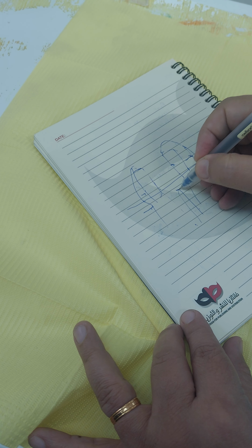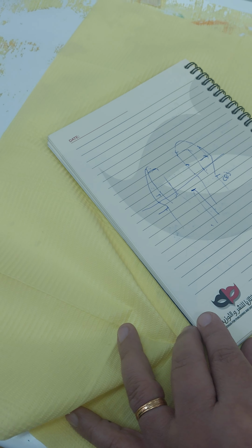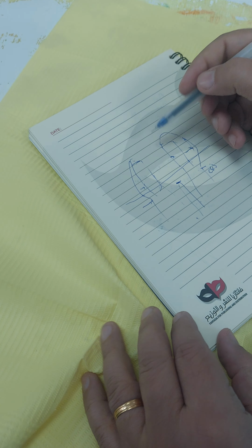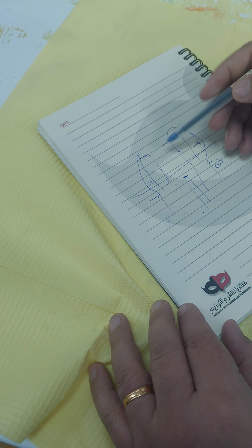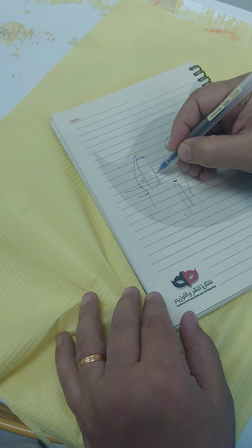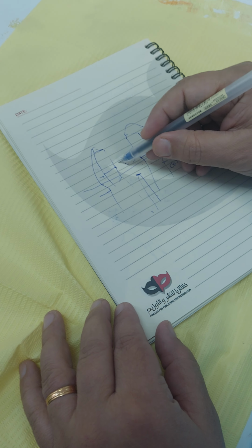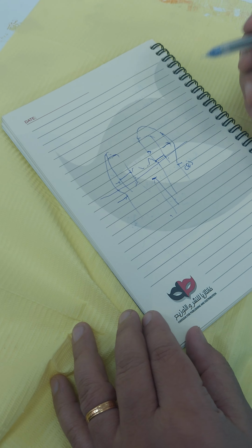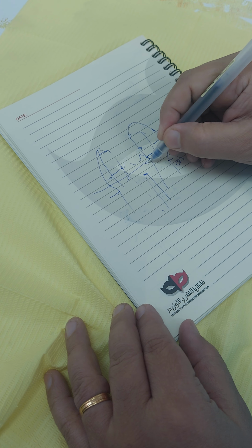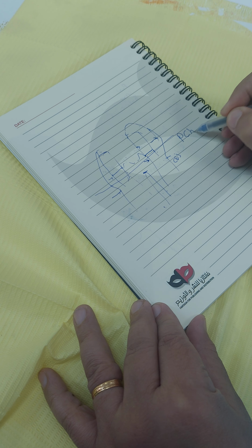It's corresponding with the floor of the pulpal chamber, usually. Okay, so this dentin here is called pulpal dentin, the pulpal chamber. So these were the horns of the chamber before the endo was done. So these are all the walls of the pulpal chamber. So this is the pulpal chamber.